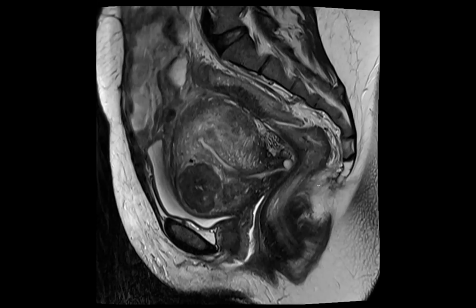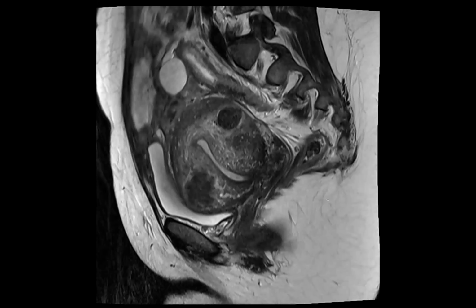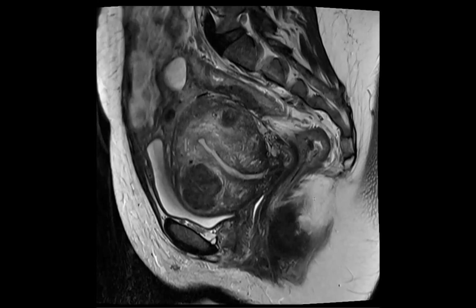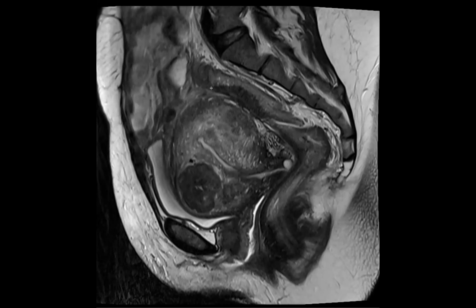Where's the new? I am looking at it, you know. Did they do anything to the uterus? There are fibroids. The junctional zone is thickened a lot. I see a mushroom, a really long mushroom there. Yeah, really long. Super long. Right there, right? Yeah. So there's a pretty long segment of involvement.